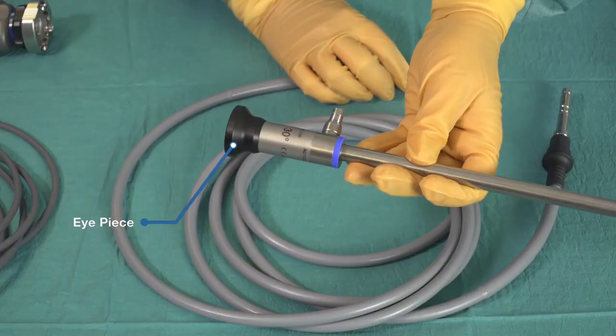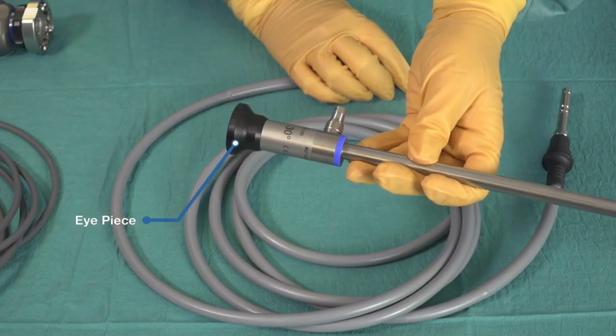So now that we have our telescope ready to deliver light and view the anatomy, how do we actually view the operative field? We could eyeball through this eyepiece here, which we call the ocular, but this isn't necessarily ergonomic nor conducive to maintaining a sterile operating field. What I want to do is digitize this image so that I can transmit it onto a monitor. That way my assistant, my scrub nurse, my anaesthetist, everybody in the room can see where the procedure is at and we can all work together for optimal patient care.